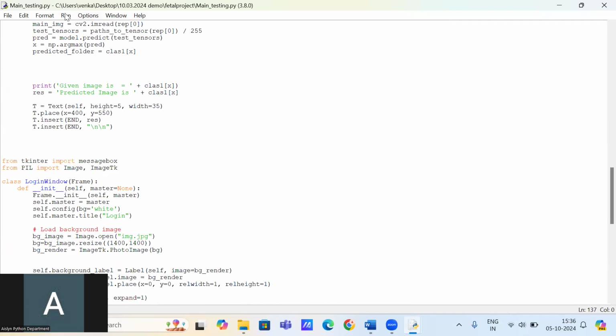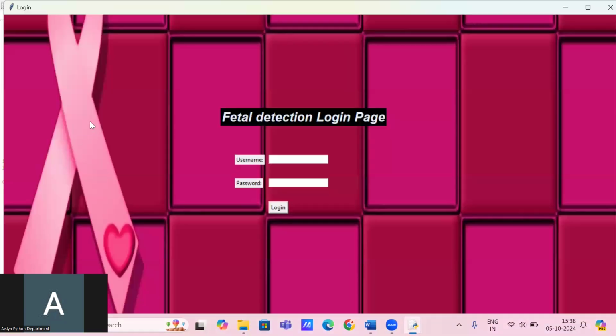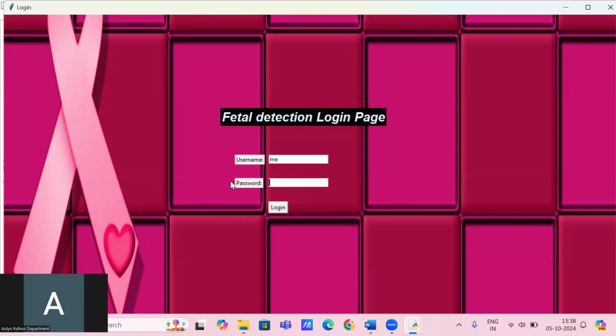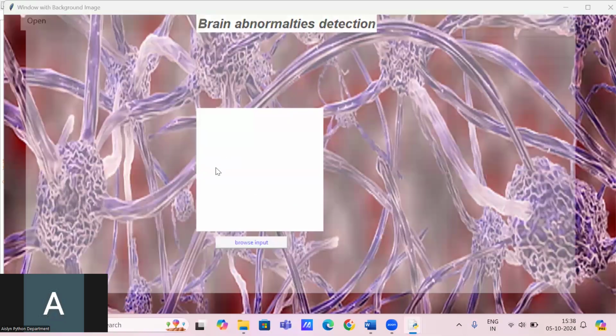Now I'll run this program. Here I'll browse the input.